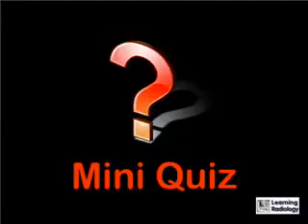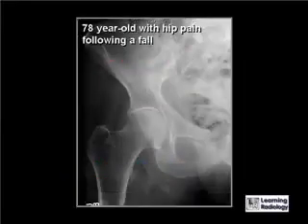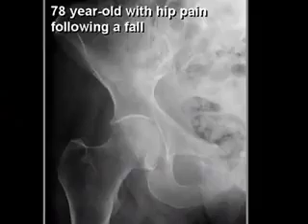This is your mini quiz based on the material that we've just covered. Here's a 78-year-old with hip pain following a fall. Examine this image. You can pause your computer or MP3 player.